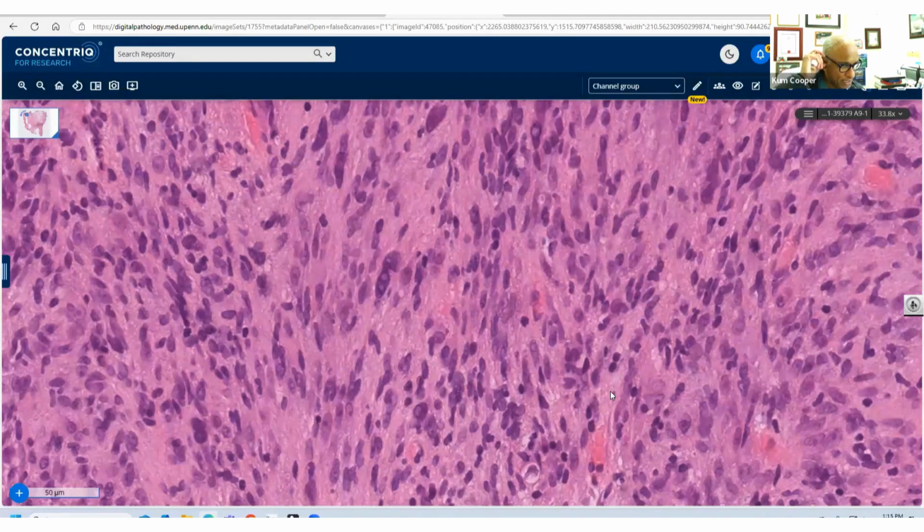Now, that's a good point that Maria brings in, because if you thought that this was a muscle tumor and you did the muscle markers, some of the MPNSTs can have diffuse myoid differentiation. So be careful of that, particularly in context of where the tumor is coming out of the nerve roots in the paraspinal area. You think this is nerve sheath, but it's giving you diffuse muscle marker immunoreactivity. And you say leiomyosarcoma, be careful, because it could be an MPNST with extensive myoid differentiation. That's not my thoughts. That was Dr. Hornick, and I think it was Dr. Fletcher who described that in AJSP a few years ago.